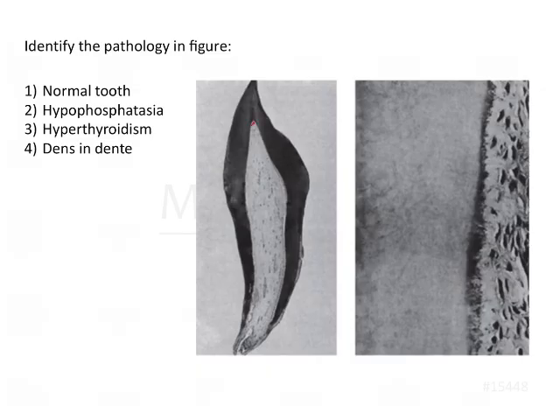What you're seeing is the pulp chamber, which is wide. This is the enamel, this is probably the cementum, and the dentine, sorry. So the enamel would be somewhere over here. This is the cementum and this is the dentine. So all of this is the dentine. In a normal tooth in general, you will see a constriction and then you will see the root. So first, number one, you cannot see the cervical constriction.